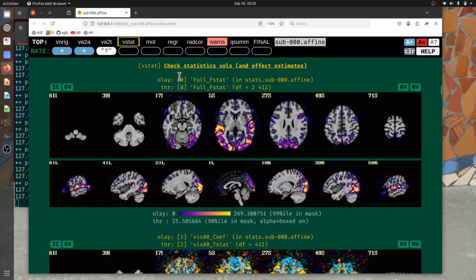Okay, so that can be useful to check. Do I check that all the time? Probably not. But in particular here, since where I see strong vstat kind of makes sense visually, I will probably be happy enough, and I might not look at that always, but it's good to know it's there and its purpose.